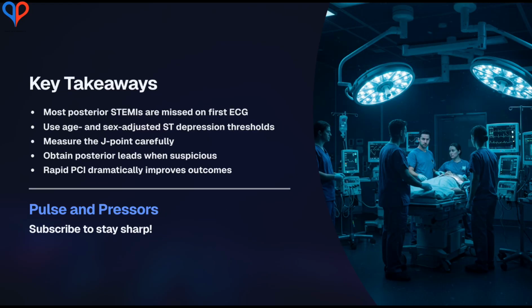The overarching message is that posterior MI demands a high index of suspicion. Most are missed because clinicians search for ST elevation and fail to recognize its mirror image. Using precise J-point measurement, applying age and sex-specific criteria, and obtaining posterior leads transform diagnostic accuracy.